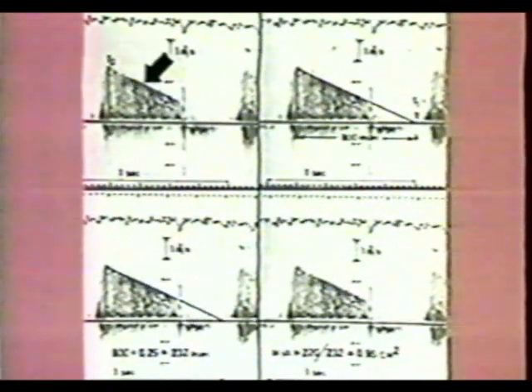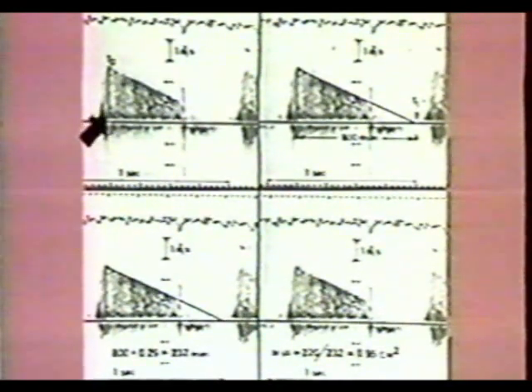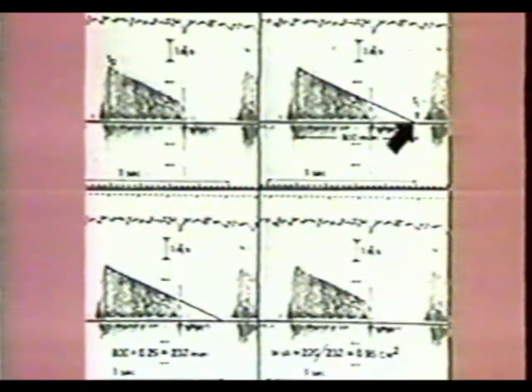This is a continuous wave Doppler spectrum from a patient with mitral stenosis. The maximum velocity has been identified, and a perpendicular has been dropped from it to the baseline. A straight edge was placed along the spectrum, and the deceleration slope has been drawn. This slope has been extended beyond the Doppler spectrum until it reaches the baseline, or zero velocity.